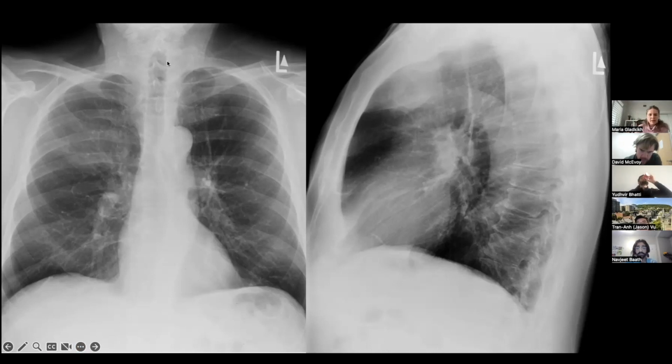Okay, so in this chest x-ray, we see that in the right upper zone, there's a fairly large radiodense structure, well circumscribed on the bottom, but at the top, you can't really see the margins very well. And you have all of these parenchymal markings passing through it. You can't really tell, is it intraparenchymal? Is it extraparenchymal? It doesn't have the appearance of a classic intraparenchymal lesion. You'd expect it to be a little bit more circumscribed, but can you really tell? Absolutely not. But this should be where your attention is drawn to. I know this chest x-ray looks a little bit messy with regards to the vascular markings, more messy than you would expect, but it's fairly normal.